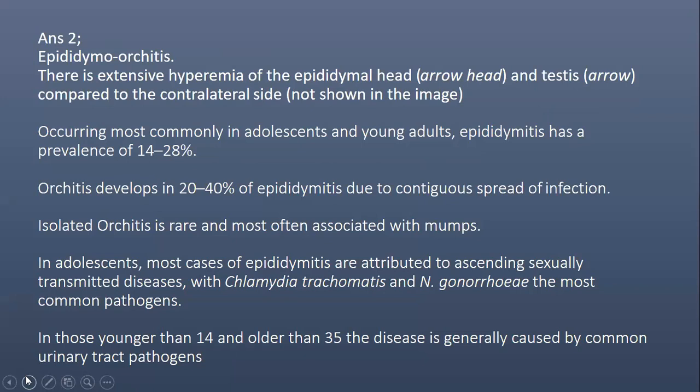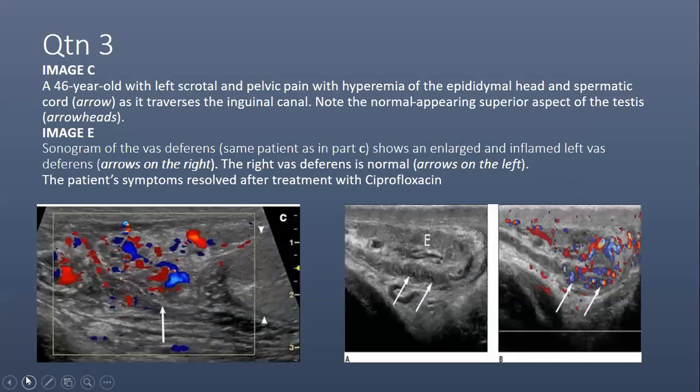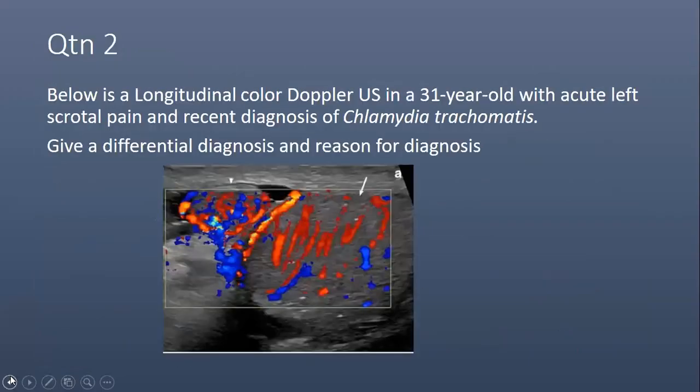The answer here was epididymo-orchitis. Why? Because of that image. You can see that there's hyperemia, a lot of flow on that epididymal head and also in the testis, involving also the epididymis. So this is a case of orchitis.